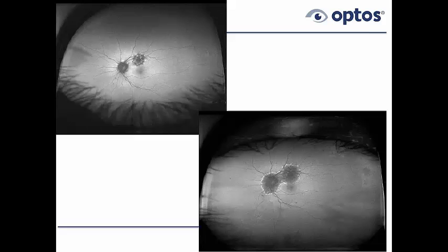We do have a paper with Larry Yannuzzi that's been submitted for publication, where we have several cases where the lesions are far peripheral lesions as well. Matter of fact, this patient, I don't have the image here to show you immediately, but this patient in the right eye has far peripheral lesions, these giant concentric lesions all the way in the periphery. That second eye also started in the center, but now that she's had AZOOR for many, many years, for several decades, the patient does have a peripheral lesion. But AZOOR usually is closer to the disc. It's usually more of a central lesion.